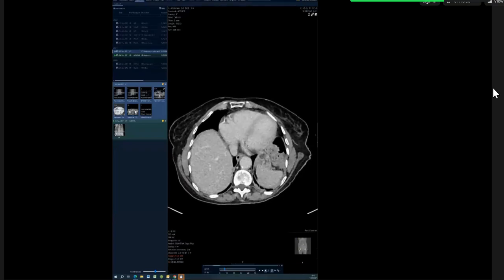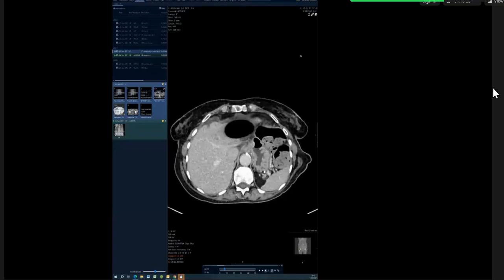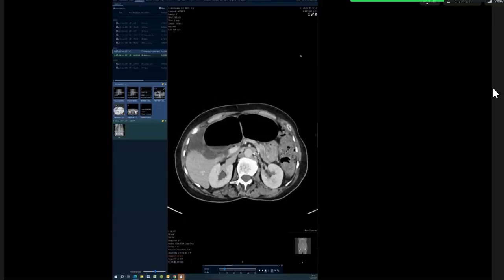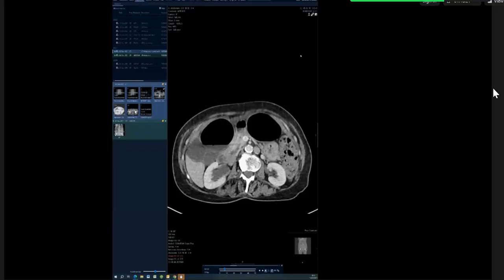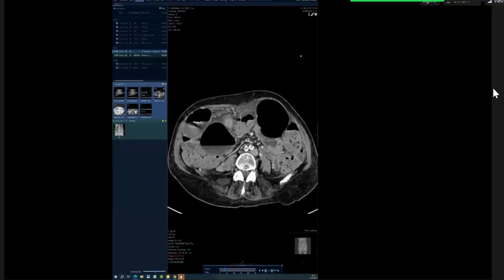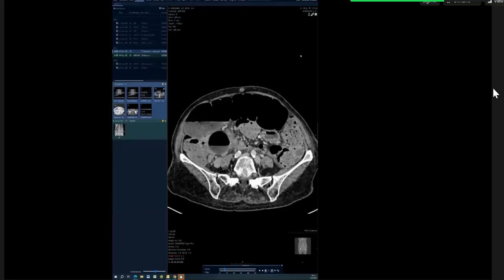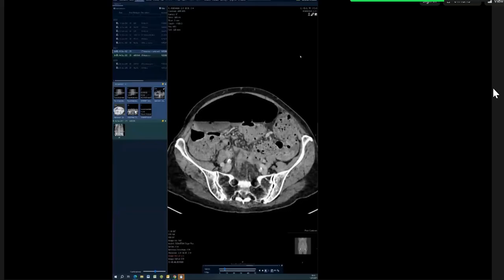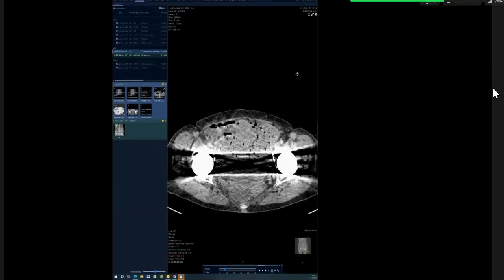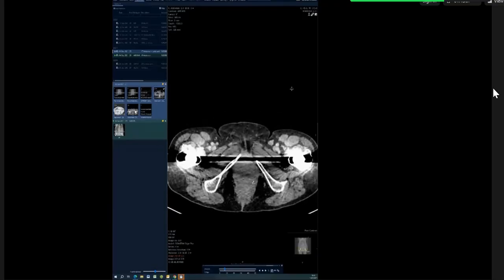I am provided with a contrast enhanced CT of the abdomen. From the first instant, I can see that there is dilatation in the colon, at the level corresponding to the X-ray. I'm trying to approach the level of obstruction and to confirm the cause.